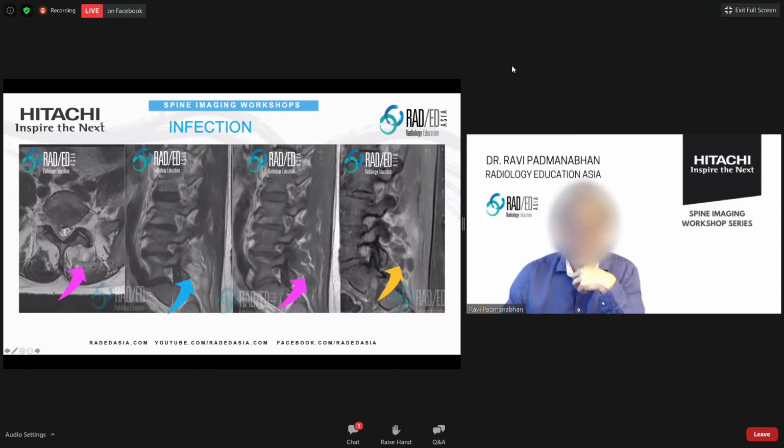But the thing that is important here is that if you look at the signal of the muscle, these paraspinal muscles, this is the normal low signal, but on this patient's left-hand side, you have increased signal within the muscle. That is a clue that something is not quite right. But the issue really is that on these standard T2s, it's very difficult to see. On T1 also, it's difficult because muscle is also low signal. It's very easy to just scroll past it.